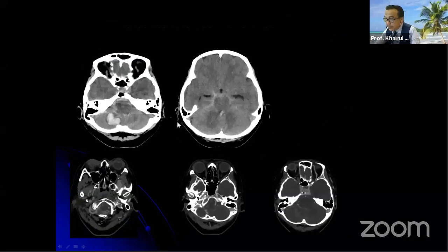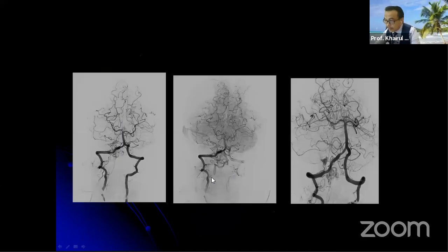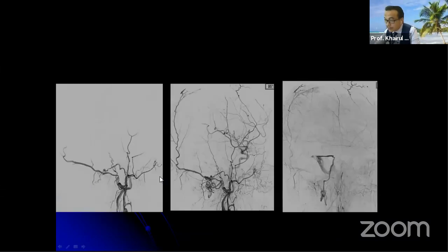Again, the patient presented with SAH and parenchymal bleed. Okay, you can see there are feeders from the vertebral artery, but nicely seen here also from the ascending pharyngeal artery. So we're dealing with a foramen magnum, skull base and dural fistula. Usually they have the ascending pharyngeal. We always don't see it, but this small vessel is very good in the treatment.